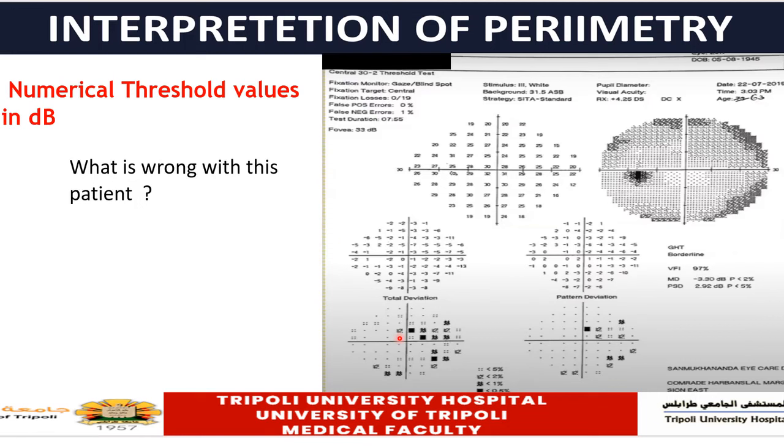In this slide, as I said, the numerical scale or the numerical data is just the raw data. That's the initial data once the machine finished, without any processing, without any statistical application. Now, these data are very important. For example, if you look at this patient, the numerical data are nearly normal, there are no minus values, and it looks within range.